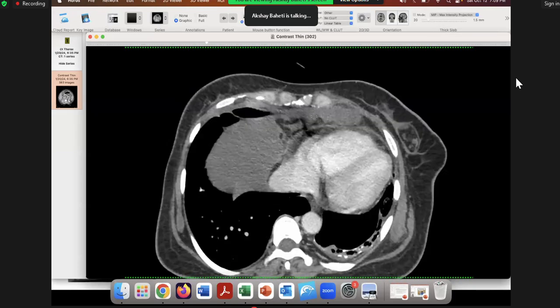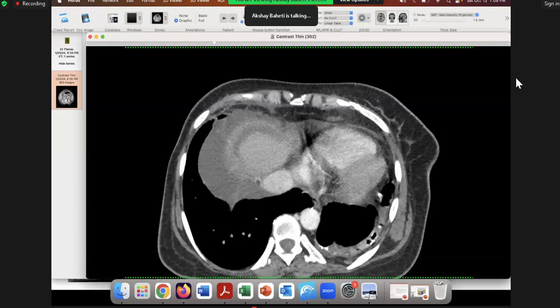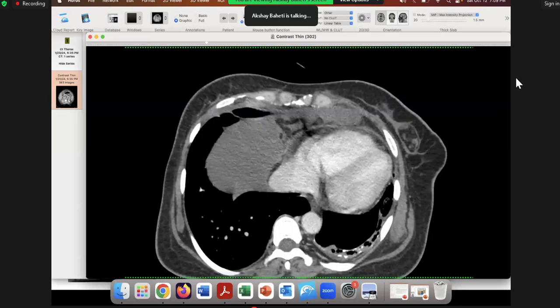Okay, and the third thing to look at is pleura. So for staging, stage 1 and 2 are essentially local disease, limited to the ovary or to the adjacent pelvic peritoneum. Stage 3 is when it goes into the abdominal cavity or the peritoneal cavity. And stage 4A is, do you know the stages? Let's see if you know 4A. You know what is 4A and 4B stage in ovarian cancer? Any idea? It's okay to not know.